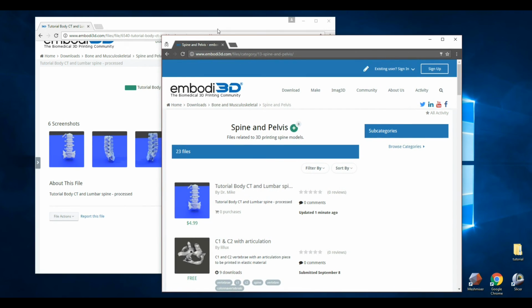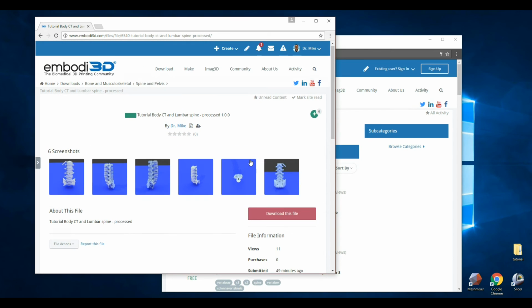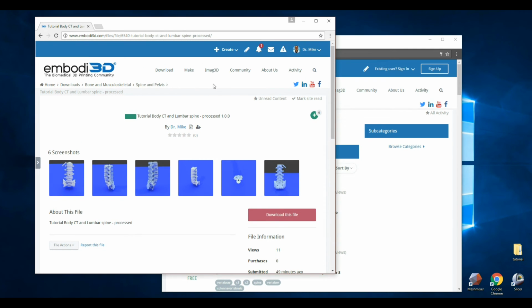Okay, so the imaged 3D printing maker, this automated service, is really amazing because it can, of course, make 3D printable bone models very, very easily. You no longer have to spend thousands of dollars on customized, proprietary software, or spend months and months learning how to use very difficult to learn free and open source software in order to make 3D printable models from medical scans.